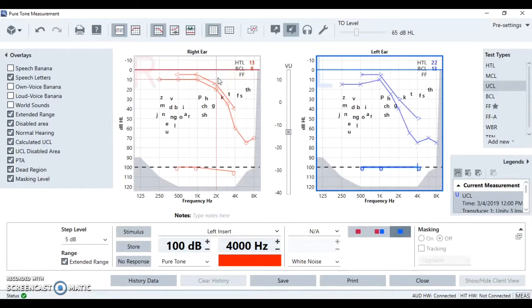Now we look here, we see these letters. That represents average tone and average volume of the different letters. And you can see if a person had this loss, those letters there, they're not hearing them at all. And then these letters right here, those are right on the edge. So if a person has a little higher voice, those are going to shift up into the range where they don't hear them at all. A little lower voice, those shift down into range where they can hear them better. They're still going to miss those sounds, but they're going to get a little bit more of these mid-range consonant sounds. Now, all vowel sounds are low frequency, but most consonants are mid to high frequency.